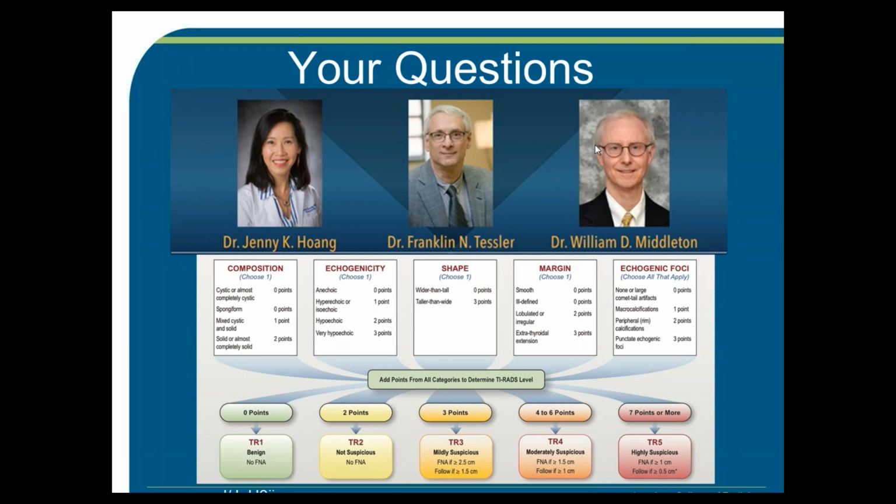So the mural nodule may have lobulated borders that would, at least in the way that I do it, give them the 2 points for lobulation. For other cystic and solid nodules, you basically do it the same way as you do for solid nodules. You look at the periphery of the nodule and look for lobulations, which you occasionally will see with mixed cystic and solid nodules, or you look for irregularity, which is much less common with cystic and solid nodules.